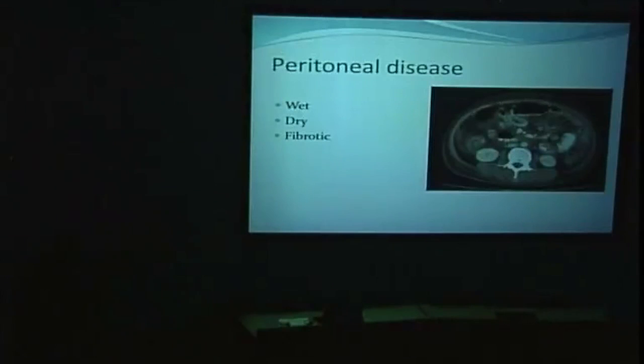Dry just means this sort of appearance. I think it's not a classic example. There's not a lot of ascites. Dry tends more to suffer from adhesions and bowel obstruction. And in the fibrotic type, you can have mass-like plaques on the peritoneum, which often can calcify.